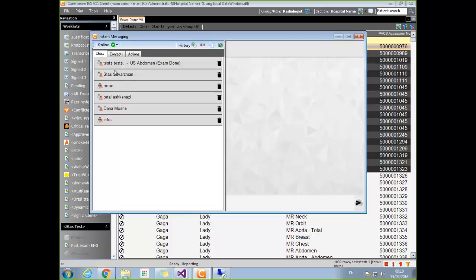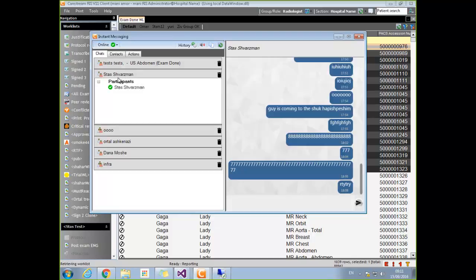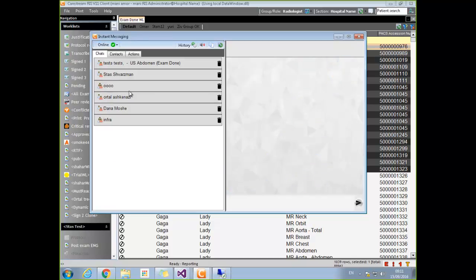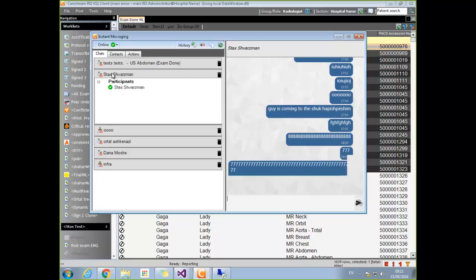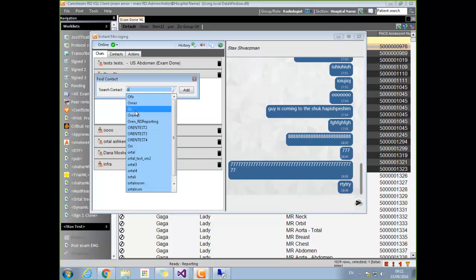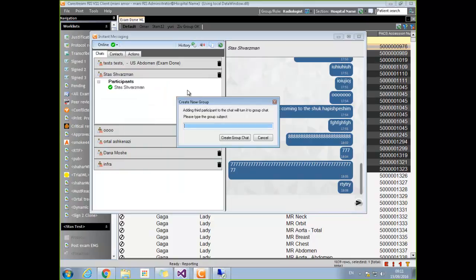So here is a chat with Stas. This is a one-on-one chat. Me with Stas. We have also a group chat. If I want to start a group chat, I add a new participant, for example, or, and here I have to give the group a name, so I'll call it group 1.